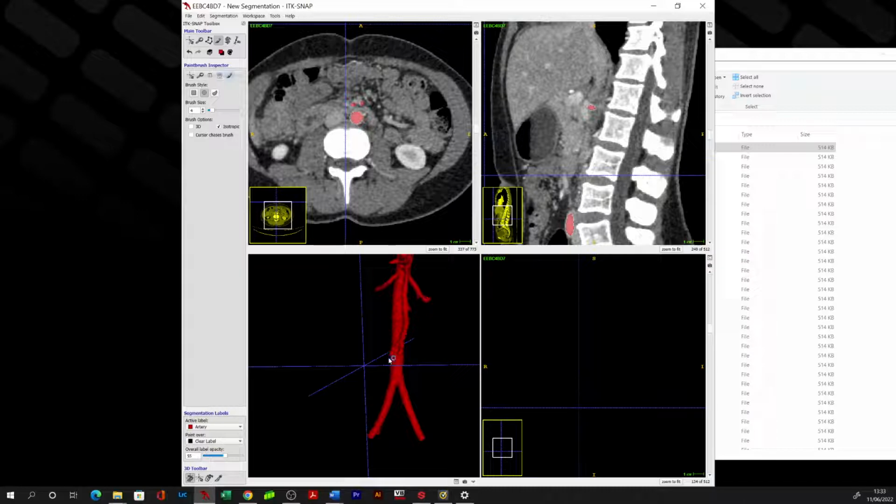If you're seeing something that's extremely unusual or doesn't look right, so for example, if you have a vessel which bifurcates off and then goes and inserts into the same vessel down the road, chances are you've gone wrong. So looking at the segmentation as you go, if you're struggling, is going to be very useful in helping you differentiate the different vessels in these more difficult cases.